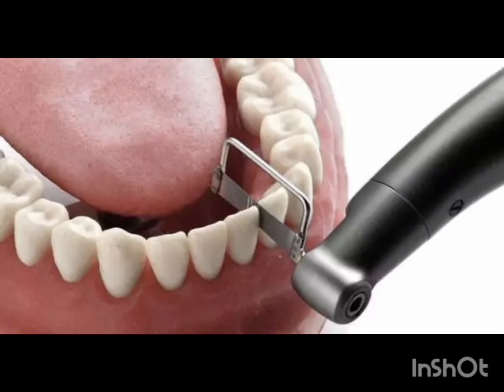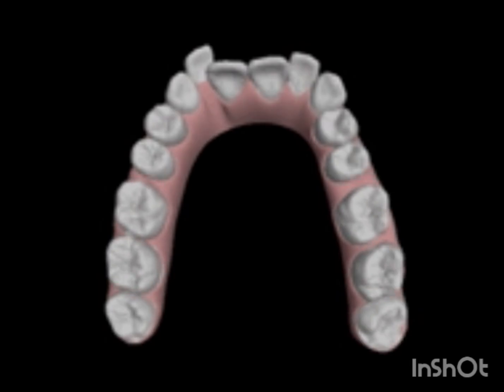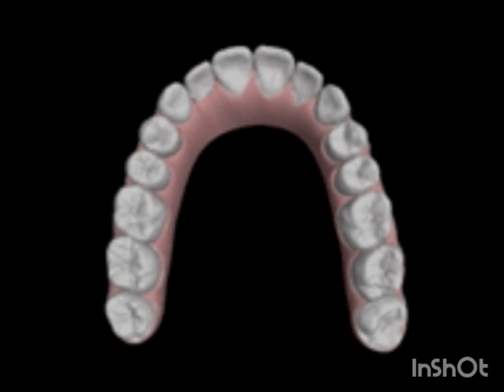So we review the teeth requiring IPR, that is, on which tooth the slicing will be done, the amount of enamel, how much enamel has to be sliced off, and the timing, when and how much is important. And how much space we will actually gain by IPR. So it should not be done blindly. Always confirm that sufficient enamel remains after reduction and avoid unnecessary IPR.